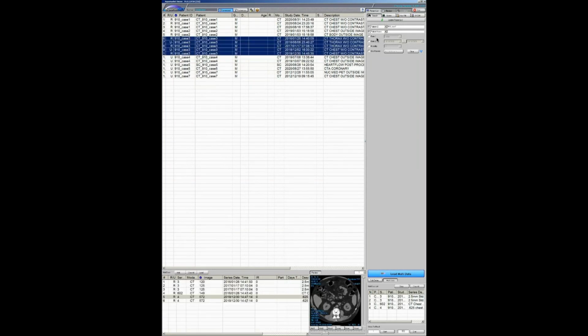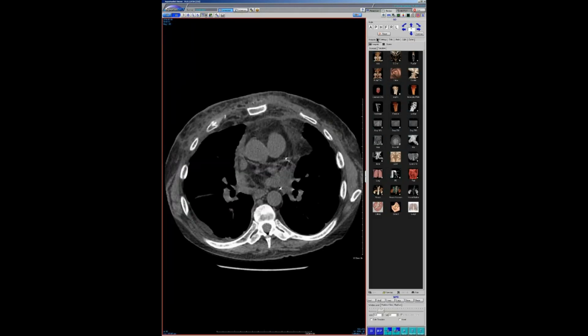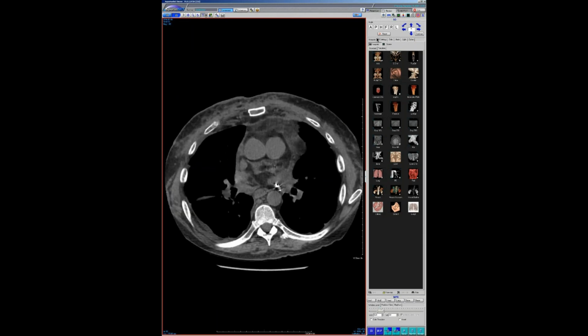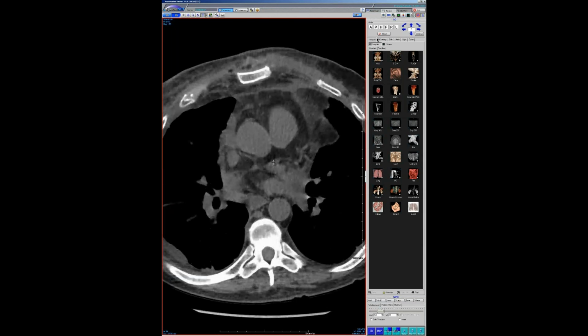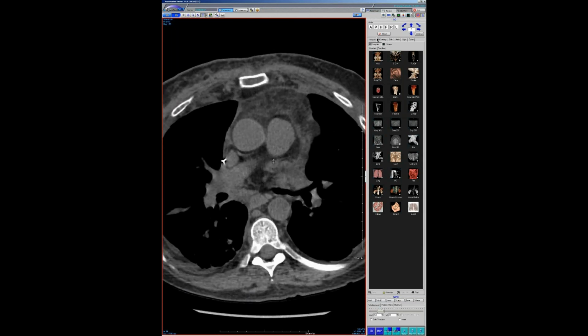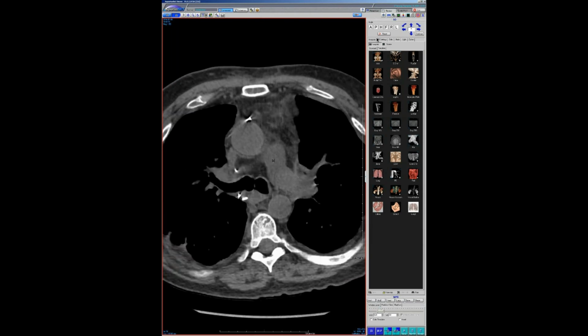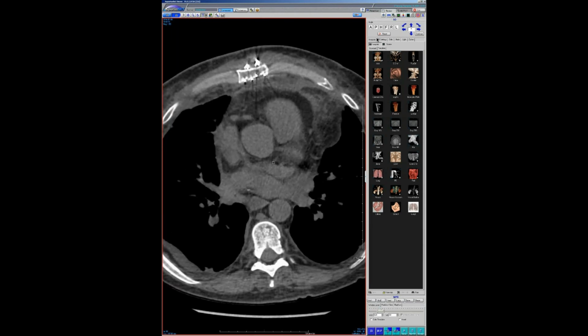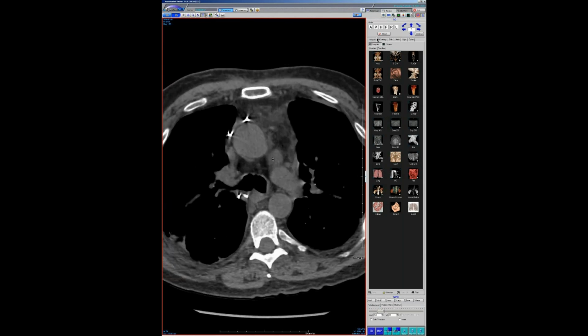I'm just trying to find the dates here. So this was immediately post-op, I think, or a few weeks post-op. There wasn't a wrap or anything else for a vascular pedicle put there. This was necrosis. Is that what you're asking? Yeah, so do we think this was from infection from the surgery or the manipulation?